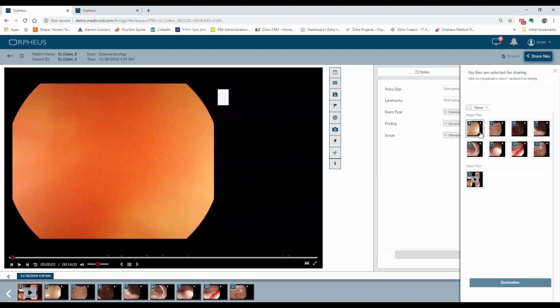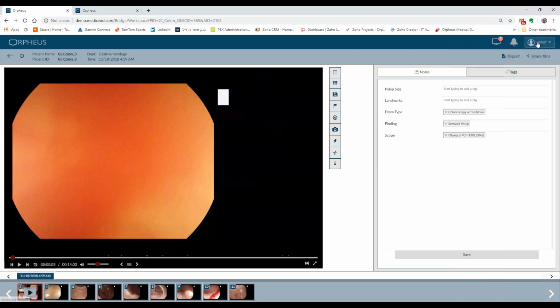It opens this panel that shows file thumbnails that you can select, and destinations. It's already been used, as you saw last week with Jeff, and I think Ken, you also did that with me when we needed to resend study files and images to ICEPI. But we'll talk about that a bit later.